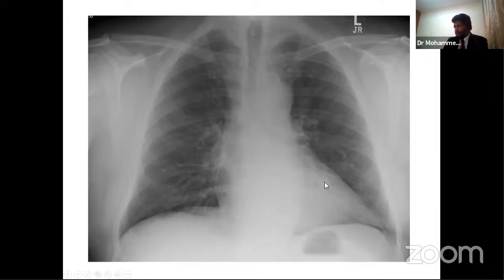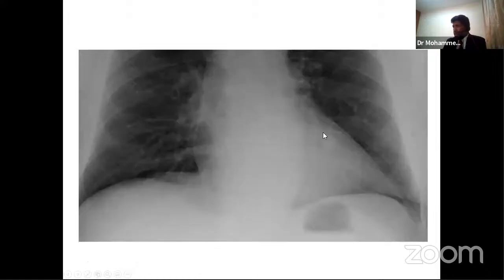This is another example of a very subtle area here. It's important that we look at these key areas closely, to rule out that there is any abnormality there, because some of these findings could be incidental, and this could be a very important finding. And if it turns out to be early cancer, we are talking about early curative cancer. And sadly, if things get missed, then it's like a missed opportunity.